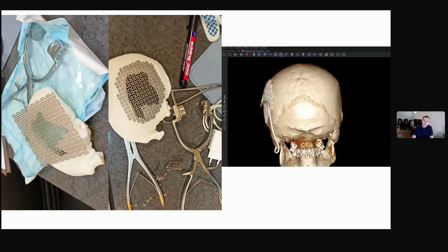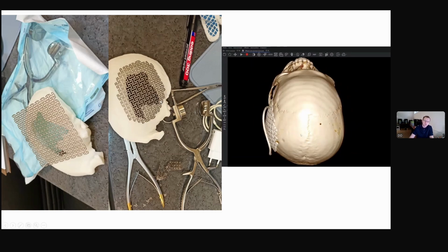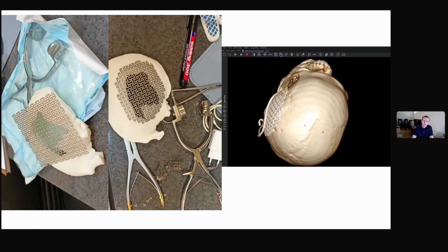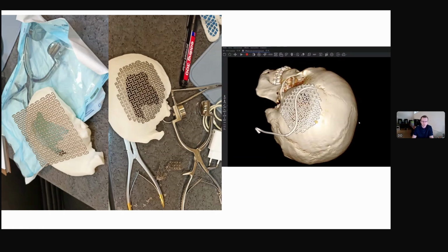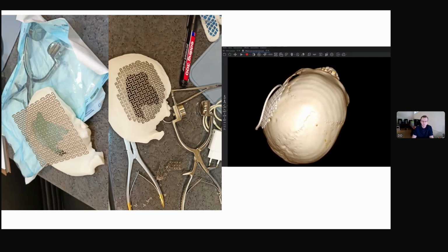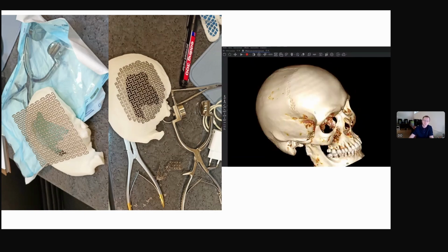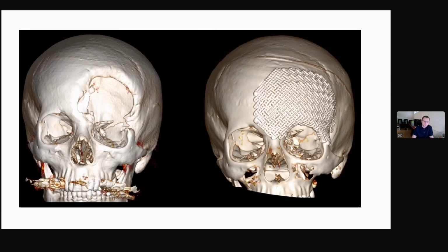With such a little fragment of a 3D printed skull, we can perform all manipulations with titanium before surgery without spending intraoperative time on it. And we can make this implant using SLM printing from titanium powder; even such complex defects can be closed using the described technique.